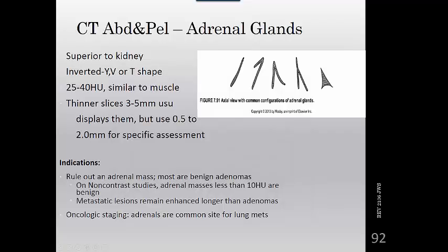All right, let's talk about the adrenal glands. The CT's become a modality of choice in detection and characterization of adrenal masses, and this can be traced to two developments in CT. First, because CT is so frequently used in the diagnosis of abdominal symptoms and disorders, it often uncovers unsuspected adrenal masses, and those are often found as a result of unrelated symptoms, so the adrenal masses are found incidentally. So a lot of times they have been called incidentalomas to describe them.